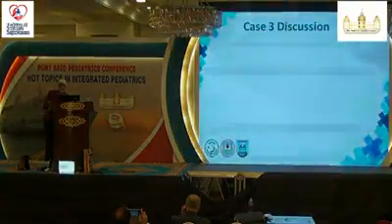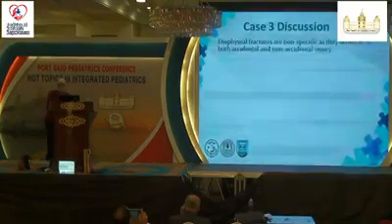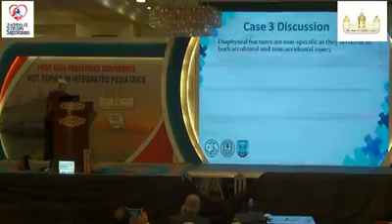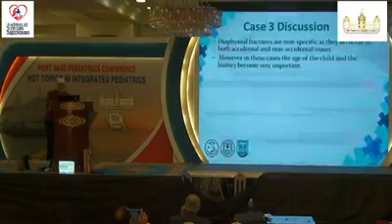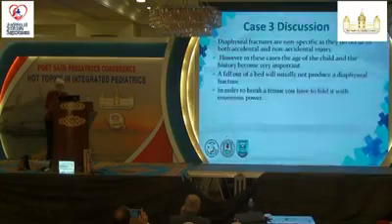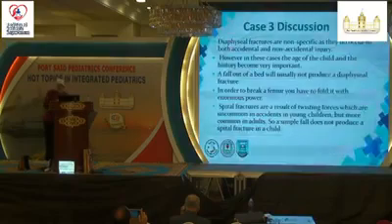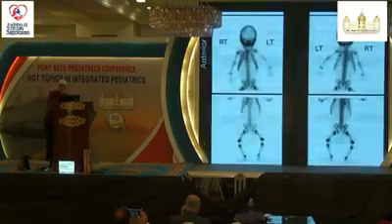So why do we suspect child abuse in this case? Diaphyseal fractures are not like metaphyseal fractures. They are non-specific. They do occur in both accidental and non-accidental injury. However, in these cases, the age of the child and the history become very important. A fall out of a bed will usually not produce a diaphyseal fracture. In order to break a femur, you have to fold it with enormous power. Also, spiral fractures are a result of twisting forces, which are uncommon in accidents in young children. So we suspected child abuse and ordered a bone isotope scan to look at other sites of fracture.